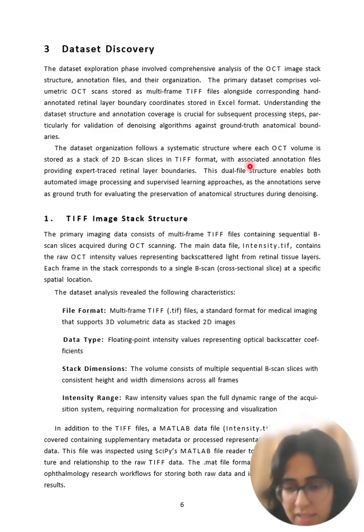In addition to TIFF files, a MATLAB data file was also provided, which contains supplementary metadata or processed representations of imaging data. I analyzed this file using SciPy's MATLAB file reader to understand what its structure was and what its relation was to the raw TIFF data.